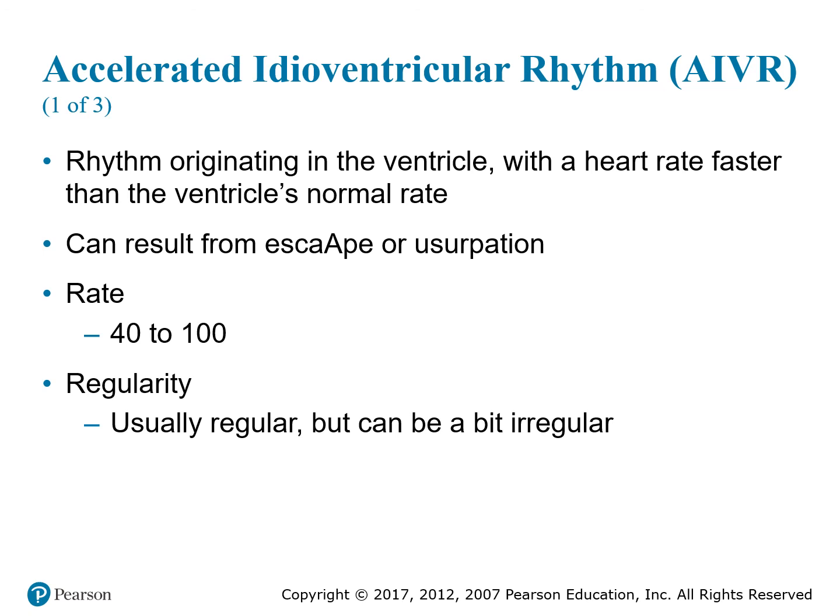And remember, paroxysmal is the start and stop suddenly. An AIVR can be called a non-paroxysmal VT. Fusion beats are often seen at the onset and end of the rhythm. So sometimes you might see a fusion beat within an AIVR also.